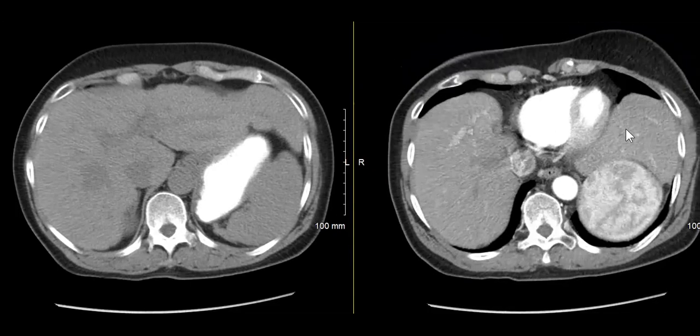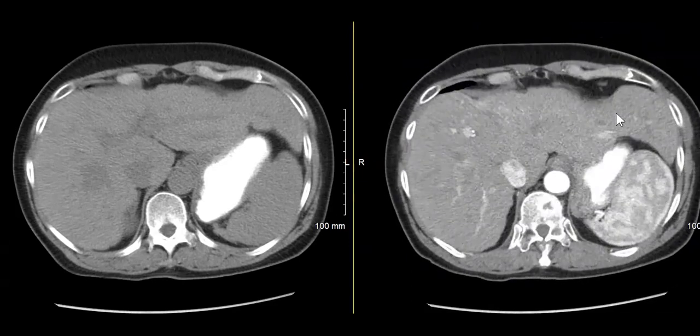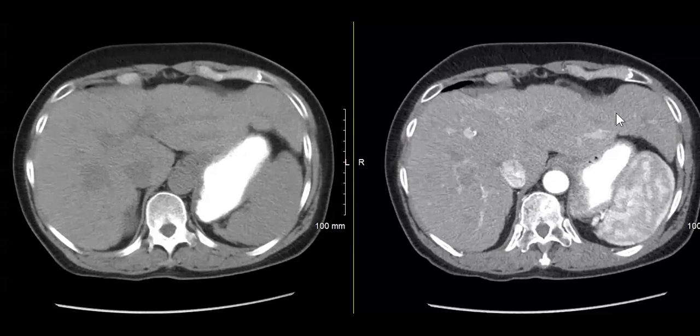Okay, so intrahepatic cholangio in the setting of cirrhosis. Patients who have cirrhosis are at risk for intrahepatic cholangio, although not as much as HCC. So far nothing unusual. The patient actually did very well. I don't remember. The patient had resection and was doing very well. So this is in 2009. In 2019, the patient had a follow-up MR, and they noticed a lesion. So what, about 10 years?